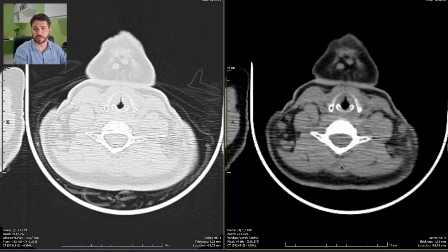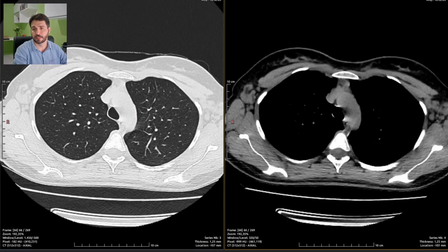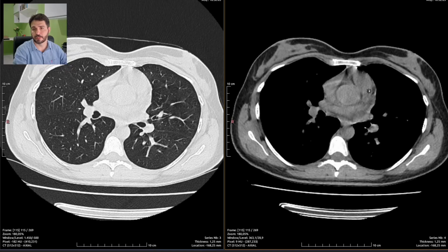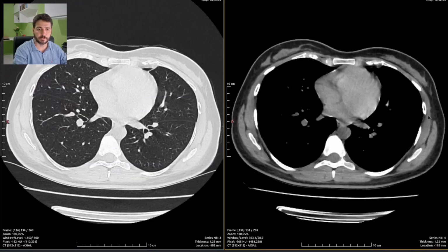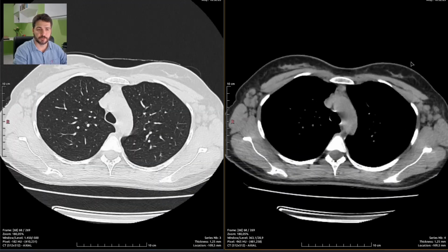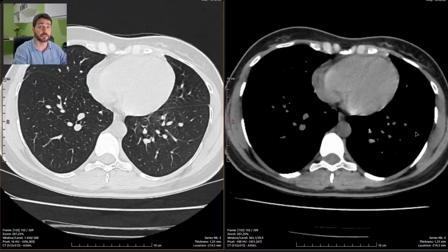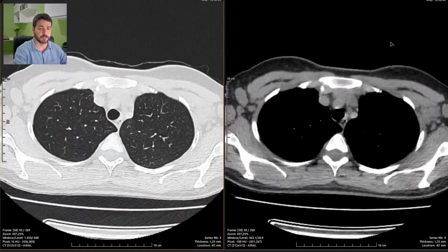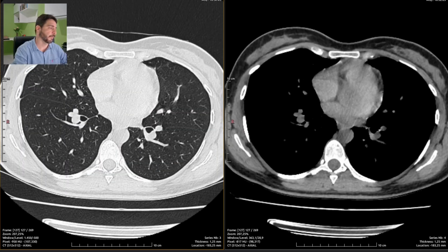So there is some kind of lymphatic disease that we really don't know anything about, because we have practically almost no clinical history about this patient. All we know is that she complains of coughing too much for far too long. So let's finish our report and move on.